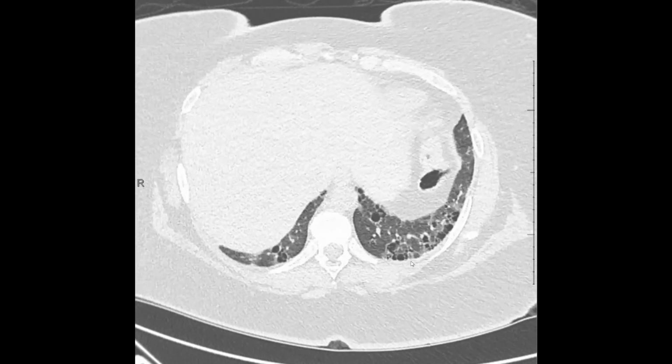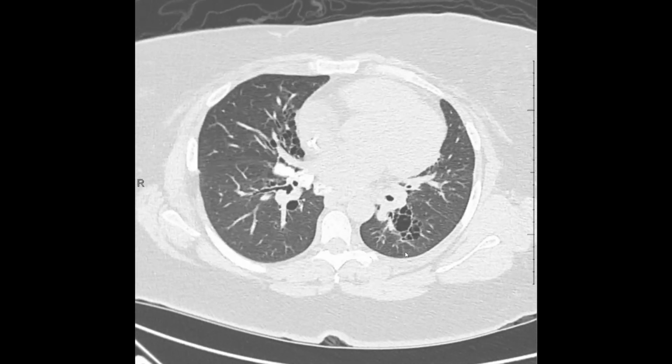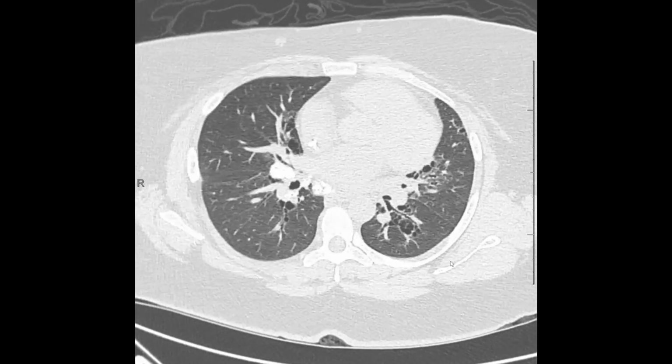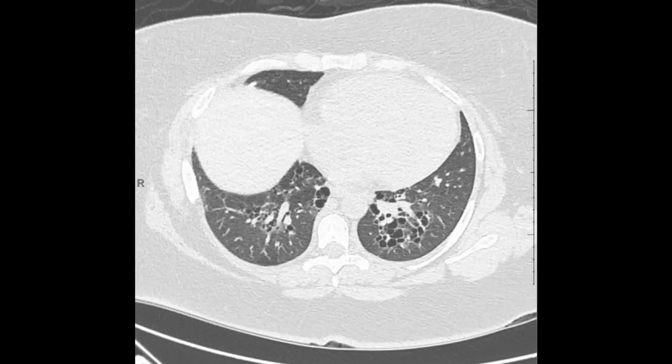But I will tell you that in patients with connective tissue disease, very often they will have this pulmonary fibrotic pattern where almost all their fibrosis is cystic like this. Sure, there's a little bit of reticulation in left upper lobe, a smidge of ground glass opacity, but by far the vast majority of abnormality here is cystic changes. So let me just show you where that emanated from.